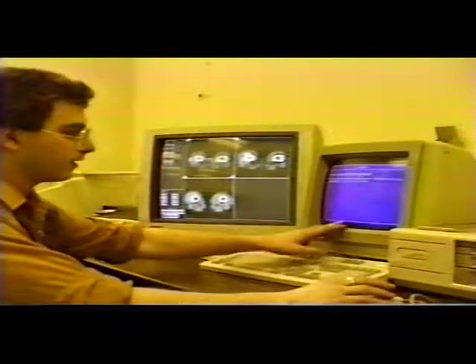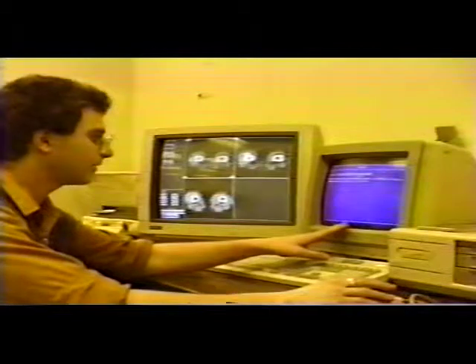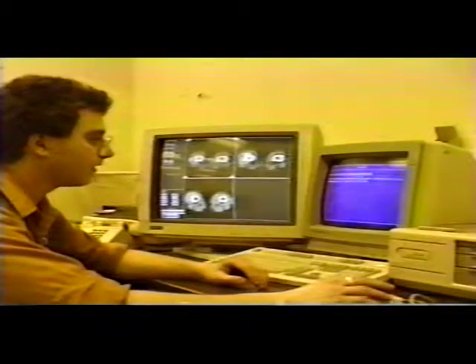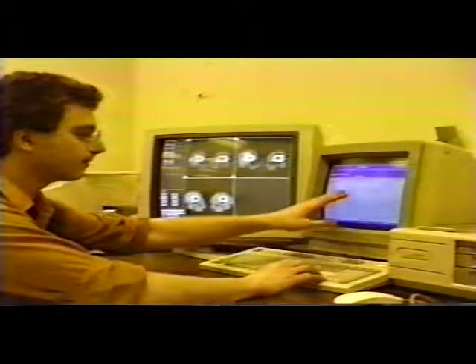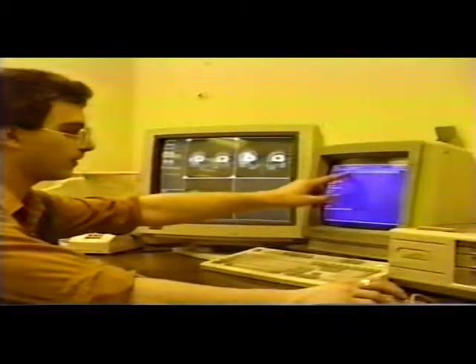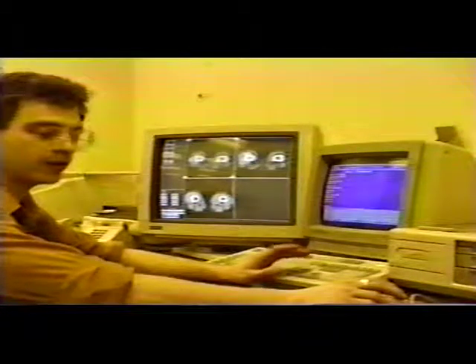On the right-hand screen at the same time is a listing. And on the right-hand screen is a report of the particular study that we're looking at on the screen. The report can be up to 8 pages long and consists of a summary, which was displayed on the directory, and text. And again, that's up to 8 pages. For every image, we also store image identification information, such as the name of the procedure, the study time, the modality, the referring physician, the attending physician, and again, comments up to 8 pages.